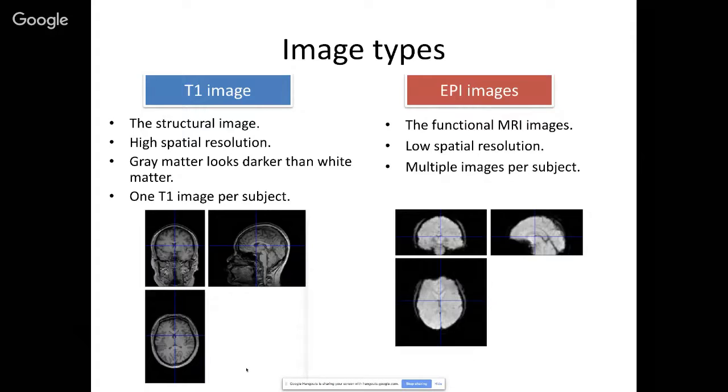The gray matter, which is dark gray, is on the outer layer of your brain tissue. This is the brain, and you can see here the darker gray is the gray matter. All of the brain activity should be located in the gray matter, because we use the cell bodies to think about something.